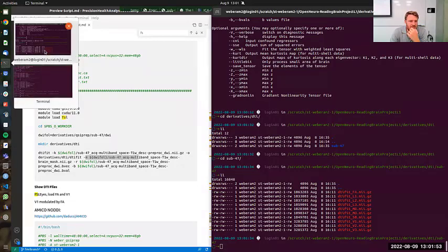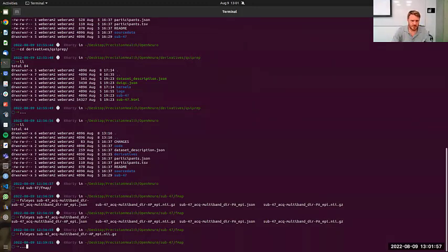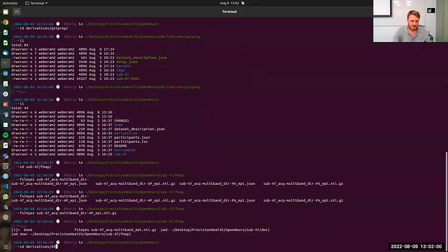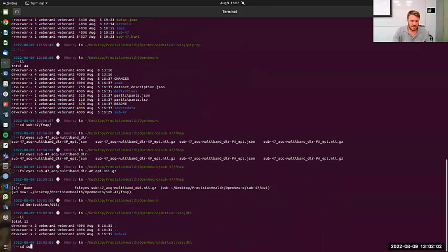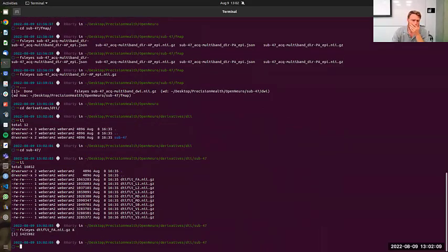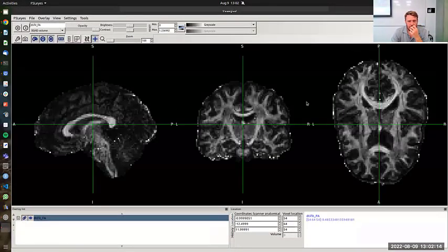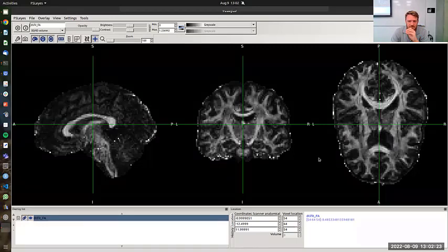I can show you what this data looks like after it's run, say I brought it to my computer at home. It is in a different orientation. You can fix that, and QSIPrep shows you how to do it. I'm not sure why they decided to have it in this orientation, but they must have their reasons.